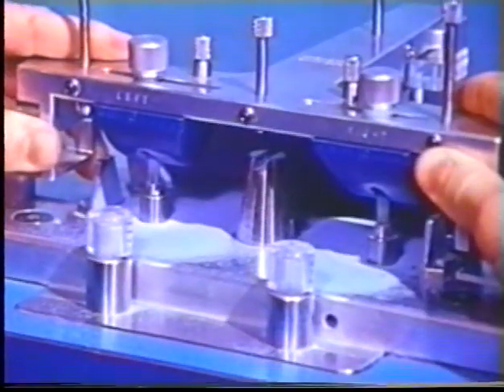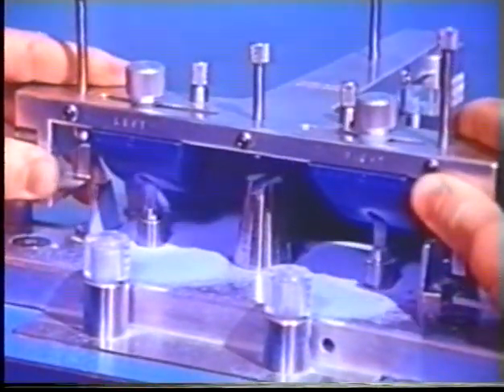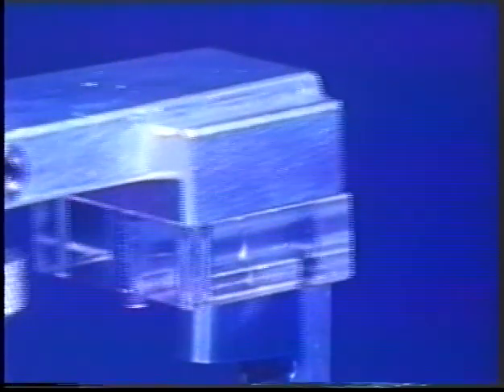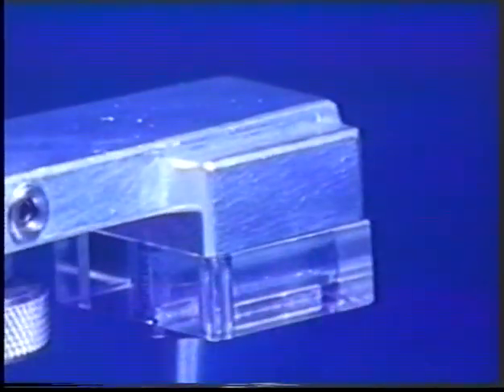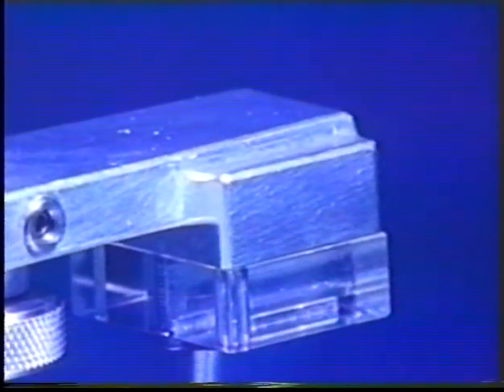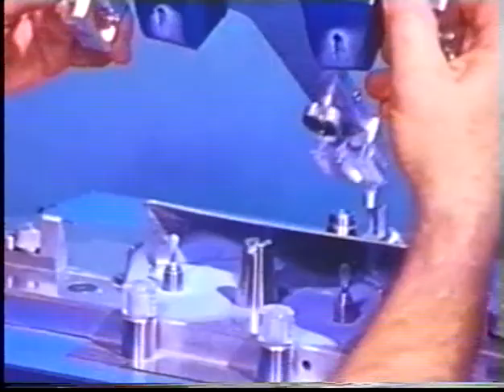In this view, we see the entire upper frame being guided by the 3 recording blocks. This close view shows the anterior block guiding the frame in the protrusive motion. We now inspect the completed protrusive movement analogs.